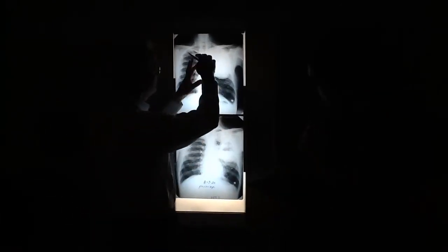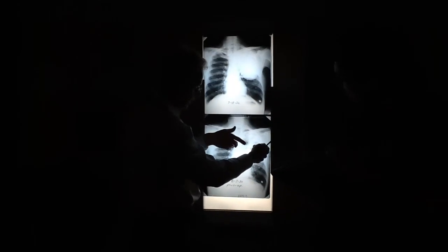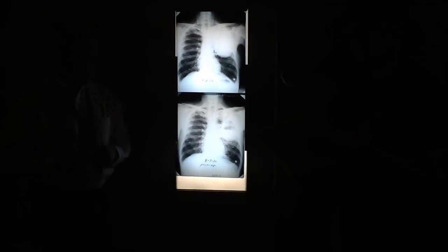So what was the post-op? So the top one was the original, and that was after. Yeah, they must have surgically been thinking about maybe removing this and probably accidentally ruptured it, which is a very bad thing to have happen, because if you spill it into the pleural space, then you got a nasty mess. These also cause infections in your brain. They also cause bone marrow infections. They cause hydatid osteomyelitis. It's a nasty, nasty tapeworm thing.